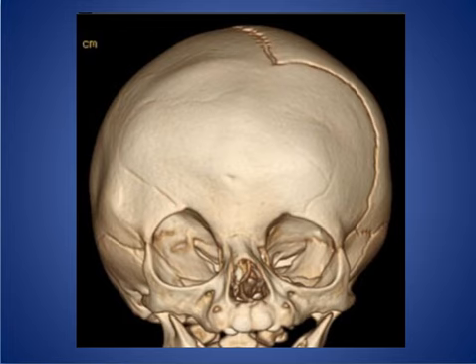Look at this case and try to pick the abnormality. This is a 6-month-old healthy boy with asymmetric face. As we see here, this is the coronal suture on the left side, and the coronal suture on the right side, it is almost synostosis, giving the asymmetric appearance of the face.